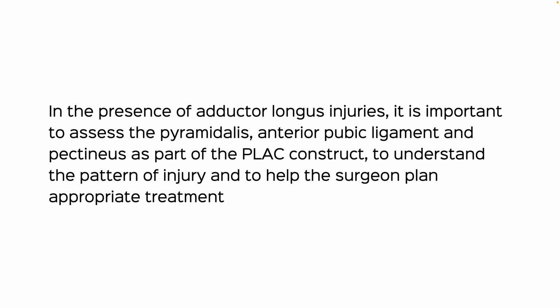What's happening to the adductor longus from the pubic bone, what's happening to the pyramidalis anterior pubic ligament connection to the adductor longus, and what's happening to the pectineus, and then put that in the report, and that should be a complete report of the PLAC.